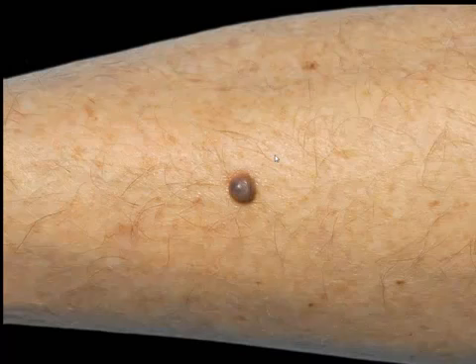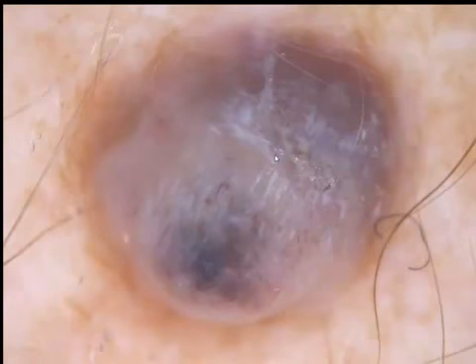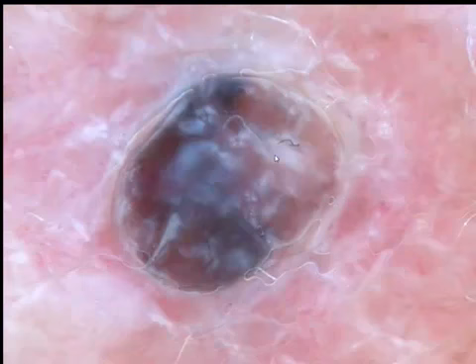This is a lesion that is a nodule. Dermoscopically, we see it's a structureless pattern with multiple colors, and the colors are that of melanin, which is brown, blue, and gray. We also see a clue, which are white lines, and the white lines indicate that it may be a BCC or it may be a melanoma, but in the presence of brown structureless at the periphery, it's more likely a melanoma, which it is.